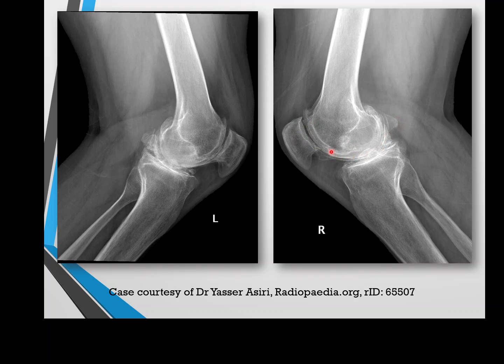But ultimately, once you look a little bit closer, you can really see that calcium being laid down on the cartilage, especially of the distal femur, bilaterally. So there's your giveaway that this is a calcium deposition disorder rather than just your typical case of degenerative joint disease.